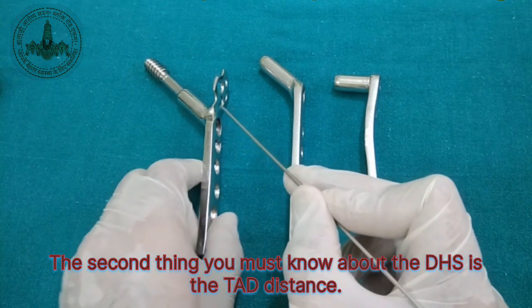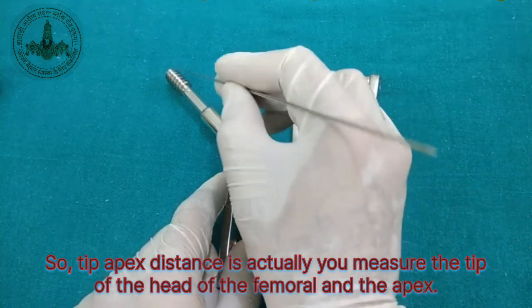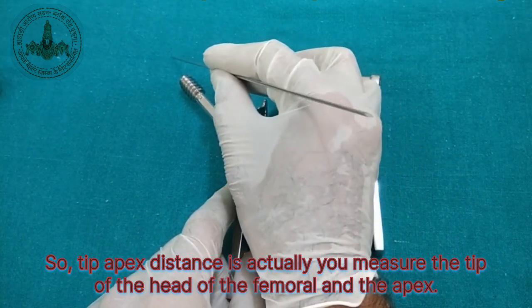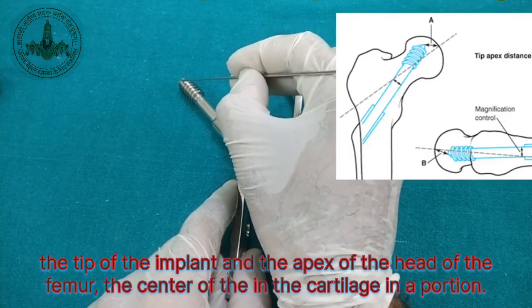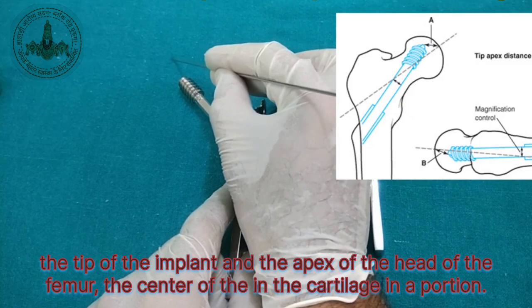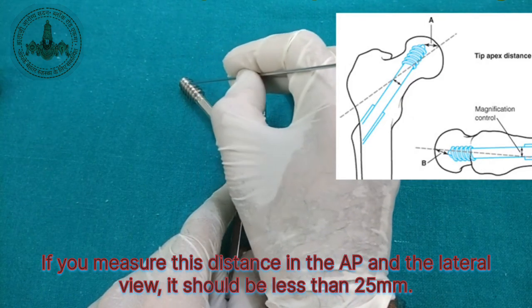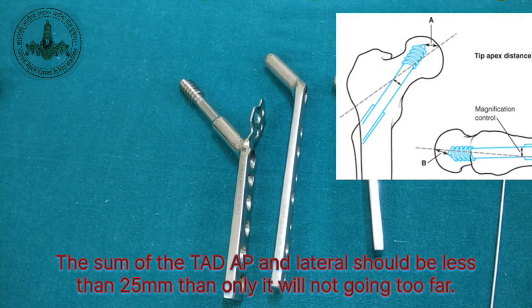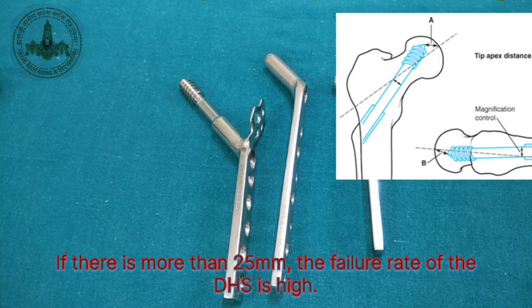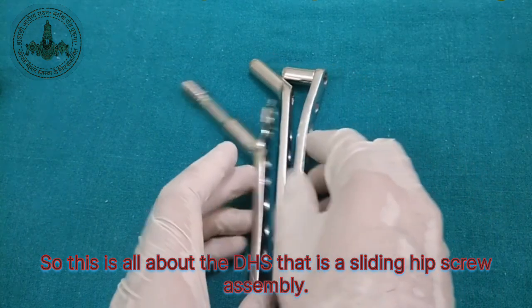The second thing you must know about the DHS is the TAD, the tip apex distance. You measure from the tip of the implant to the apex of the head of the femur, the center of the cartilaginous portion. If you measure this distance in the AP and lateral views, the sum of the TAD in AP and lateral should be less than 25 mm, then only will it not fail. If it is more than 25 mm, the failure rate of DHS is high. So this is all about the DHS, that is a sliding hip screw assembly.